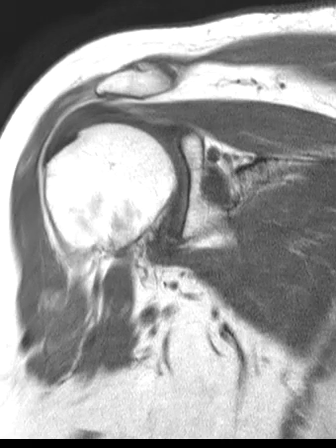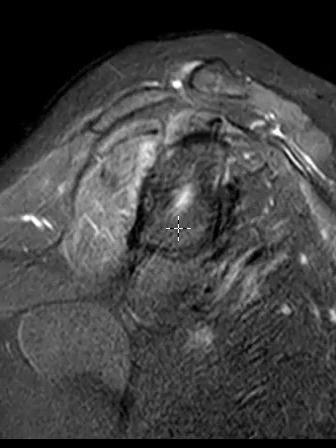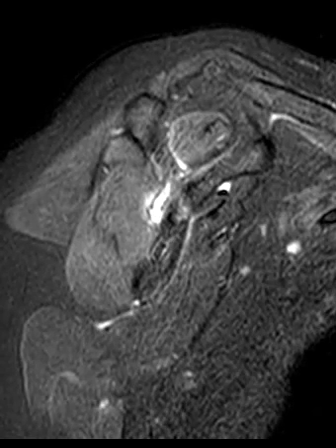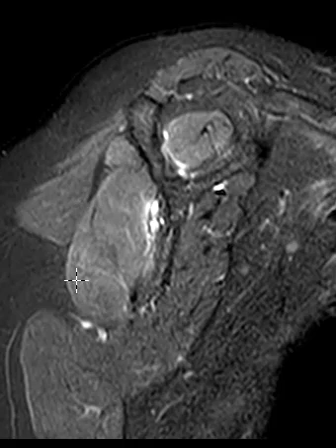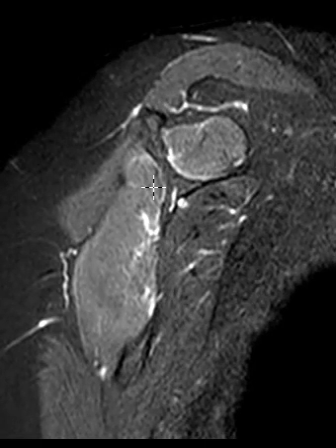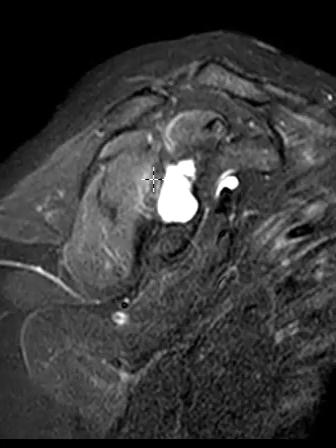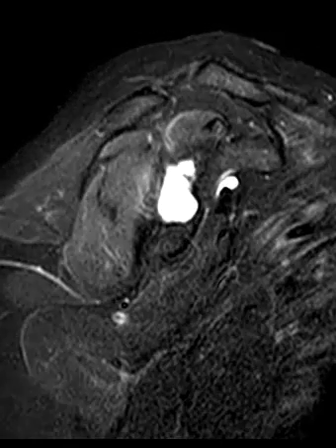Now in this patient they did have some edema. I'll put up this view here within the supraspinatus and infraspinatus muscles, also maybe the teres minor muscle, but we have edema here and here. When you see that, first thing to think of is suprascapular nerve compression, and look at the spinoglenoid notch, which we do, and say, whoa, here we go, we have this big fluid collection.